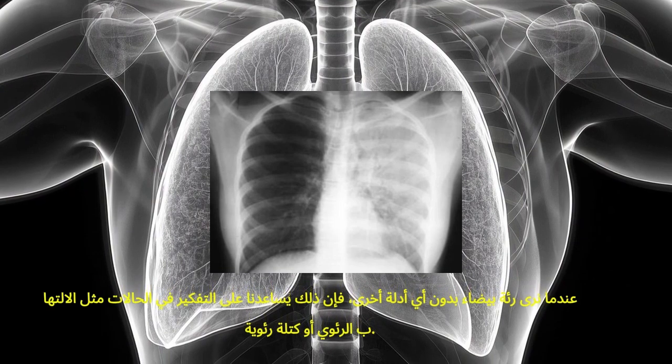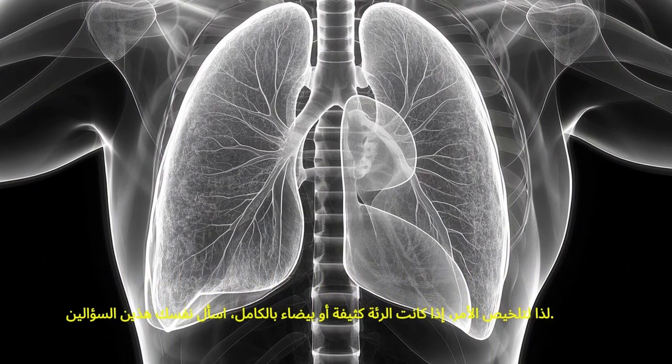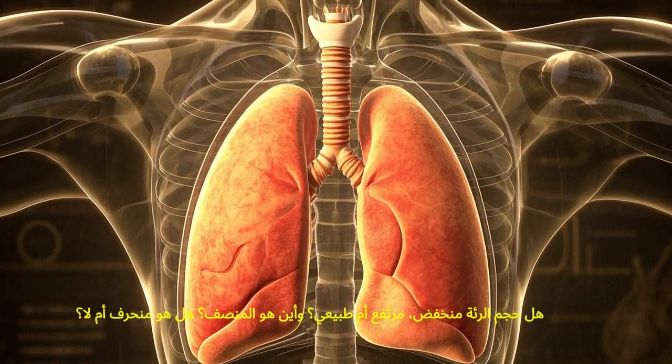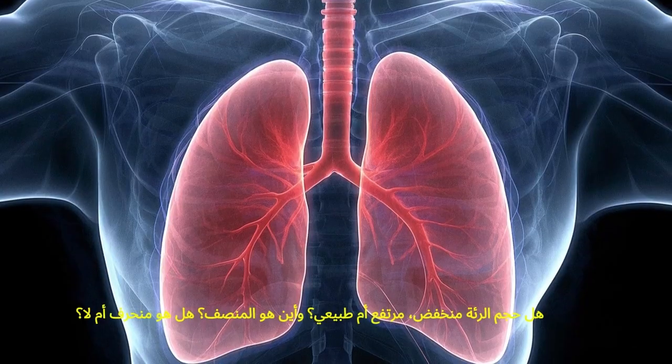So to summarize, if the lung is completely opaque, ask yourself these two questions. Is the lung volume reduced, increased, or normal? And where is the mediastinum? Is it shifted or not?